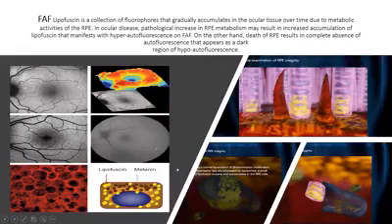It depends on the fluorescence of the lipofuscin. In the normal fundus autofluorescence image, the macular area is usually black, because there is no lipofuscin there. Also the optic nerve is usually black, and the retinal vessels are also black because of no lipofuscin.